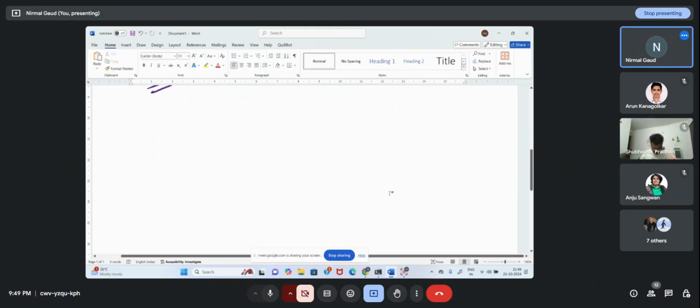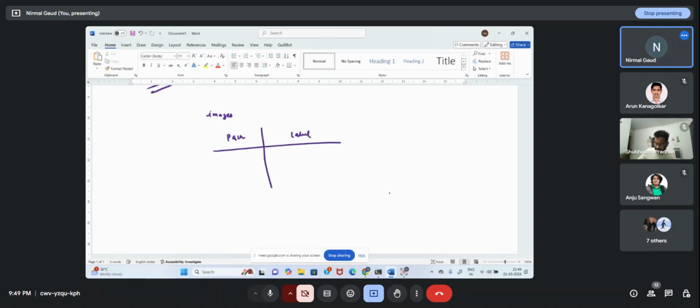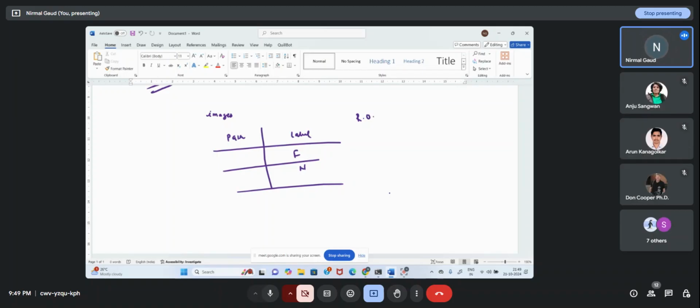Okay, see, you were having images in a folder. We made a data frame of it. How? I found the file path and put a label to it. This made a data frame for fractured and for not fractured. Got it? Then because of some imbalance, you used a random oversampling technique. And now it's all balanced.